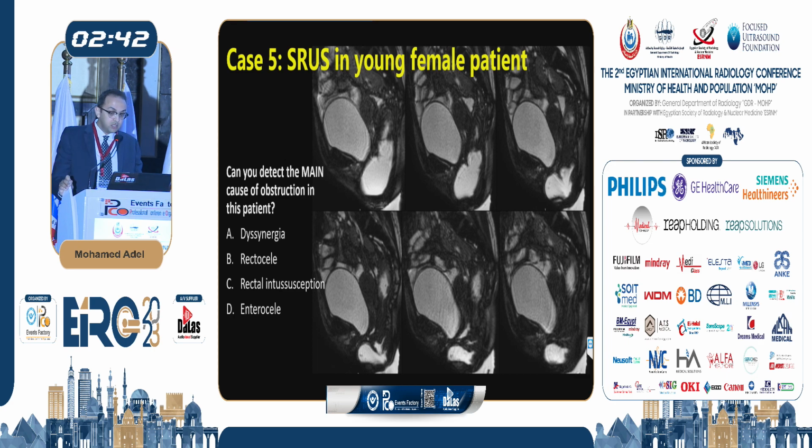She was a young patient, and her main complaint actually was more or less diarrhea and incontinence rather than obstructed defecation. So if you look at these images, I would like to make it easier and show you over here. What you see over here, there's some eversion. This looks like the sock, as we said. So there's a rectal intussusception in this patient, and this is the one causing the obstruction.